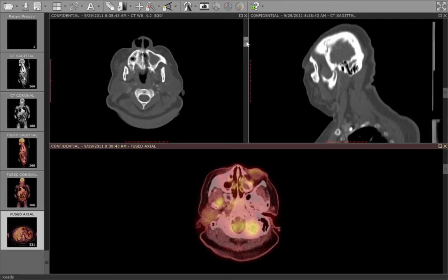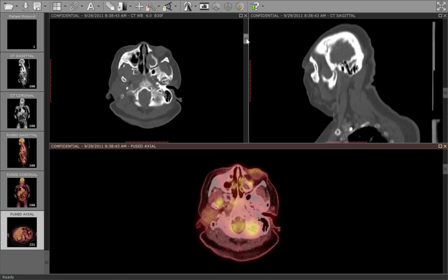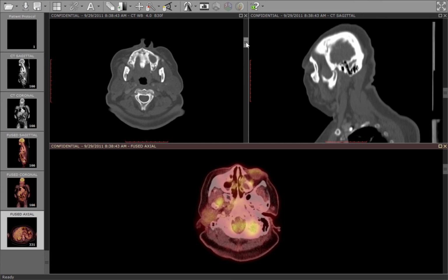And so when you see this, you want to at least think about a mucocele, where there's obstruction of the drainage of the sinus and you get secretions that build up and exert pressure on the walls of the sinus, leading to expansion. And this can lead to upward lifting of the orbital floor and can actually cause significant remodeling of the bone.